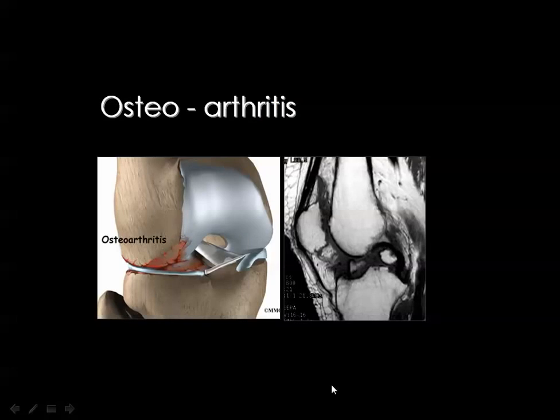In osteoarthritis, you got the usual manifestations in the knee, and as in any large joint in the body, these manifestations will include certain pathologic entities. One of them is the development of loose bodies. And you should know that if the loose body is large, it will develop a marrow cavity, and it will show the same signal intensity similar to the femur and the tibia.